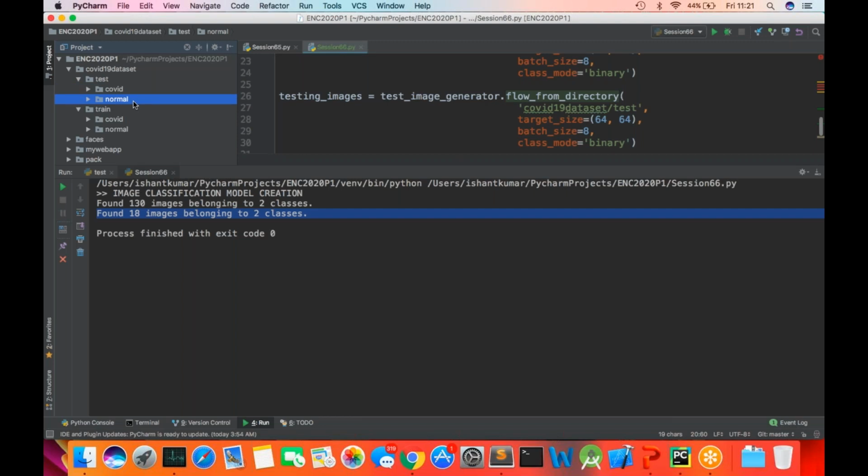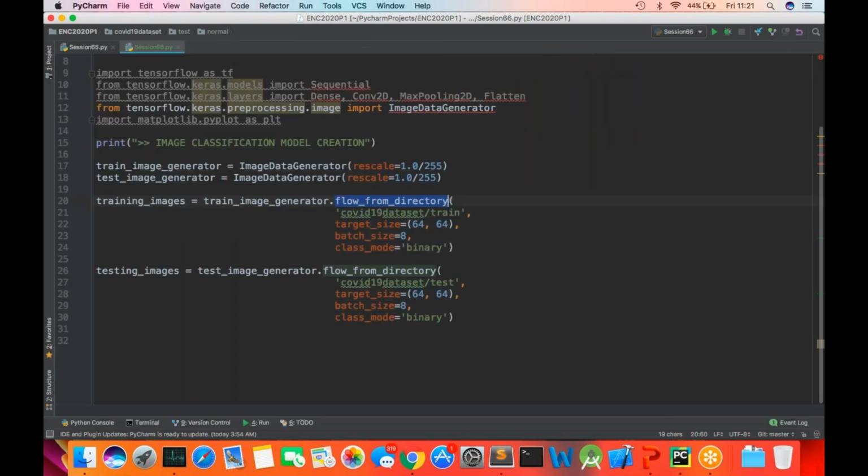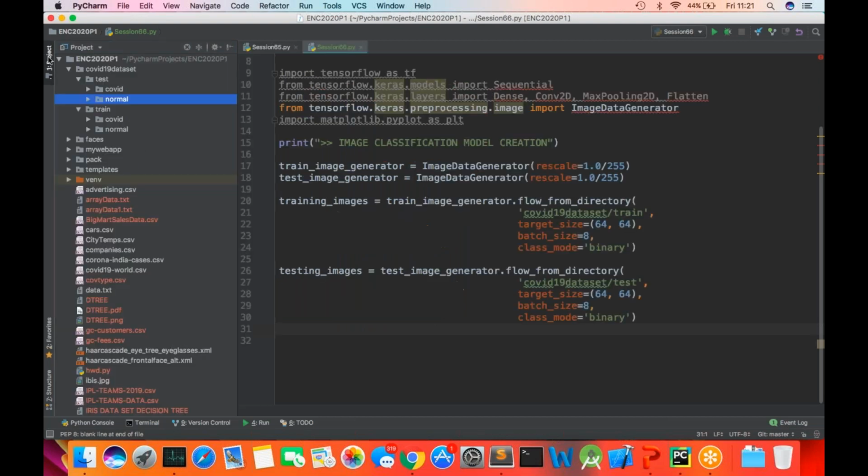So here we are solving the problem where we are trying to understand whether there may be a COVID patient or there may not be a COVID patient. Okay, so guys, let us proceed further. One more thing, right? We are not doing a medical AI model, since that requires so many other parameters to be examined. This is just a demo study for you guys to understand what image classification is. We're not working on real data sets. These data sets are from Google, may be correct, may not be correct.